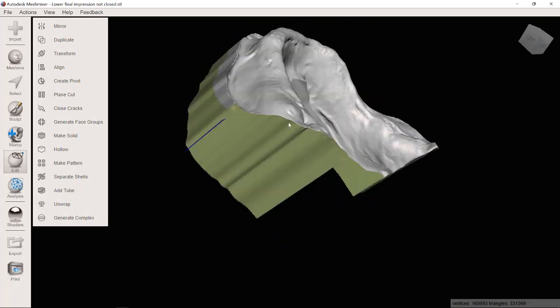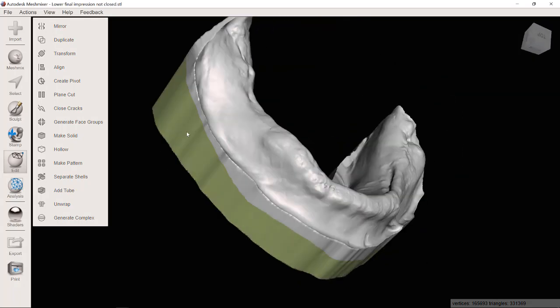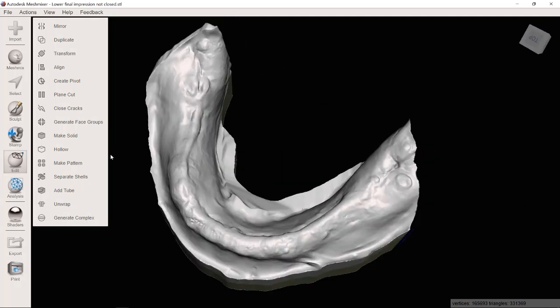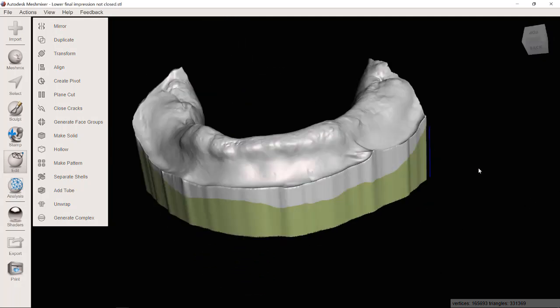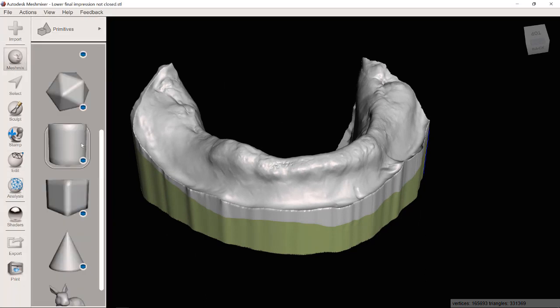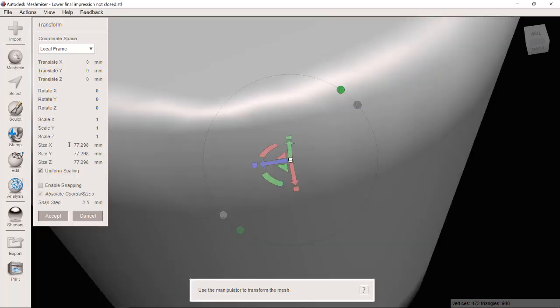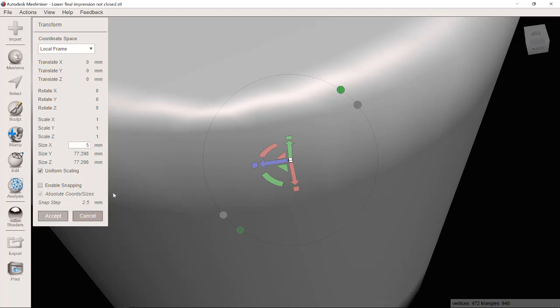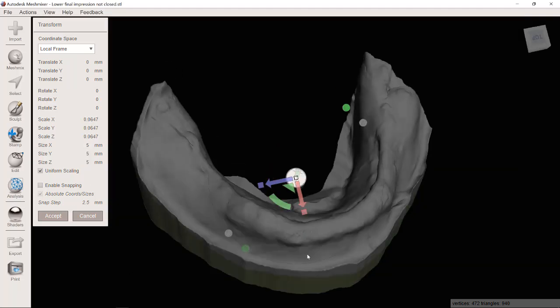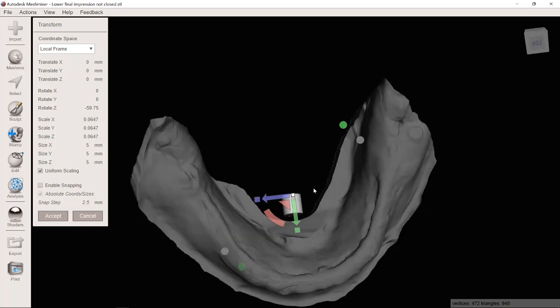But where is your resin going to escape from while you're printing it? And the answer is there is nowhere for it to escape from. So we've got to create some little holes for the resin to drain out of, the uncured resin. The way I do that, and there's a lot of different ways, I'm going to go to Mesh Mix and grab this cylinder. I'll pull it into the case, and I'm going to click on Uniform Scaling and just knock this down to 5 millimeters. So now it's taken it from a huge cylinder down to one that's just 5 millimeters in all its dimensions.